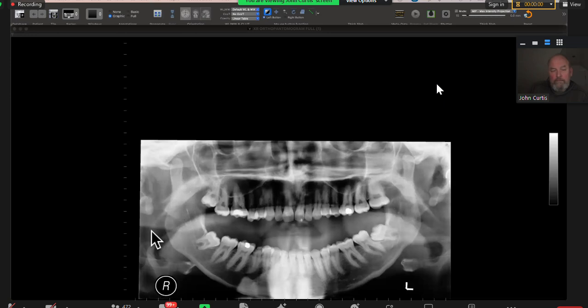The patient had a sore mouth, so there could be an... the teeth are not together. That's the... Okay, it's out of the bone where the mandibular condyle should sit, and it's now forward. That's forward as well. So we've got bilateral TMJ dislocation. Yeah, well done.